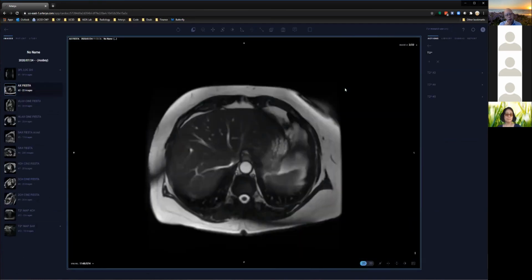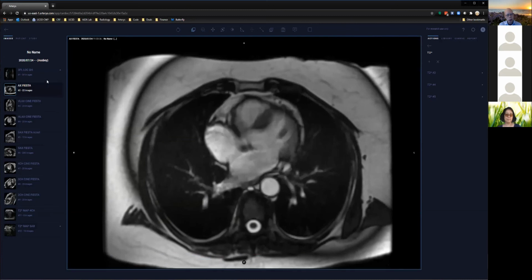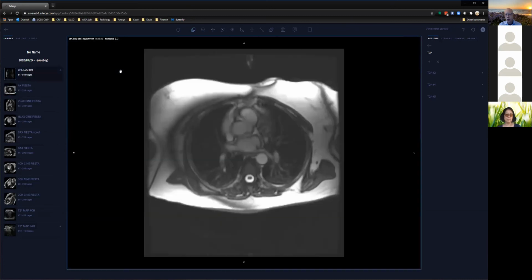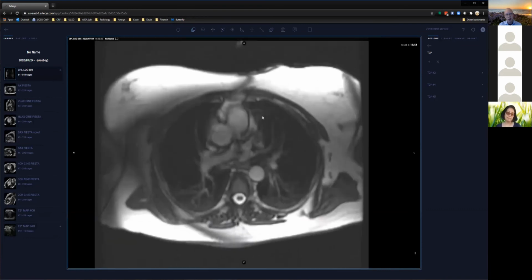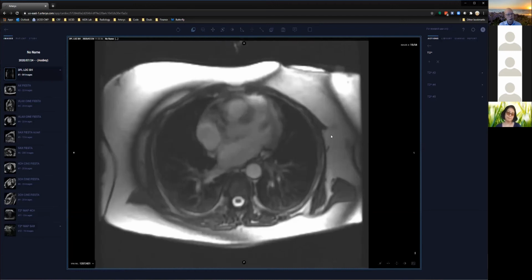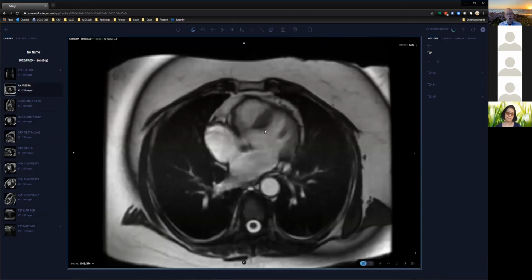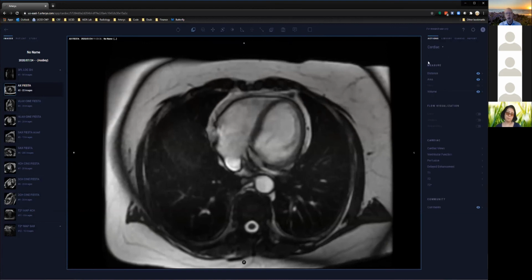We just did this iron study recently on an upgraded version of our 1.5T. Our 1.5T in our main hospital is, what is it now, like 20 years old? And we just got it lifted in one day, which is pretty awesome. This is what the images look like from our standard SSFP. You can see there's a lot less artifact. The band artifact is pushed off to the outside a lot, and our standard SSFP images are a lot brighter than at 3T that you just saw.